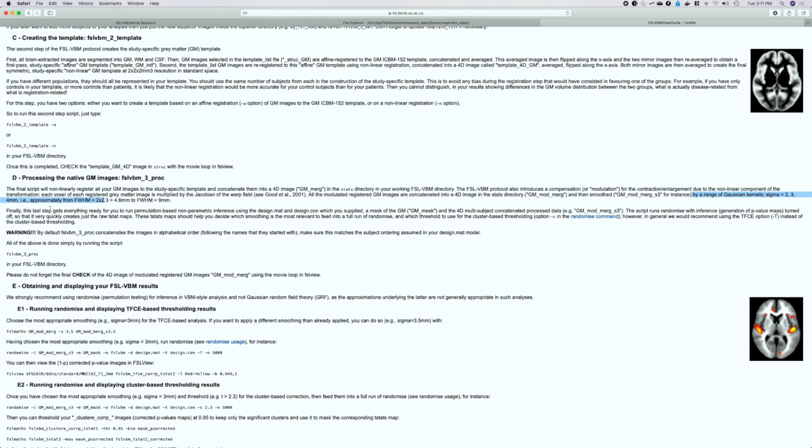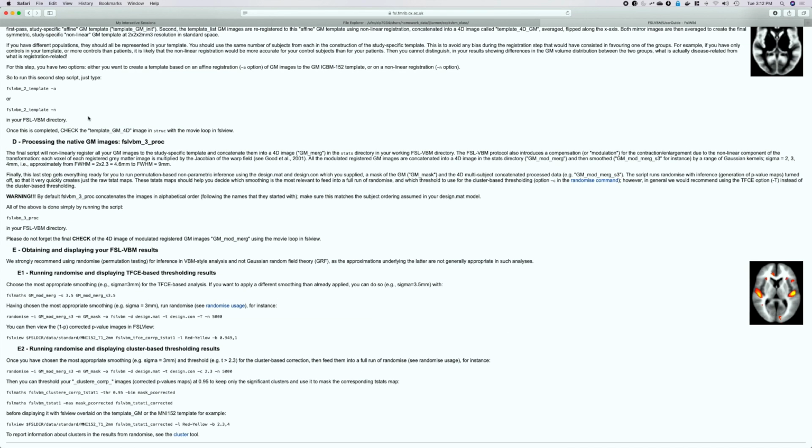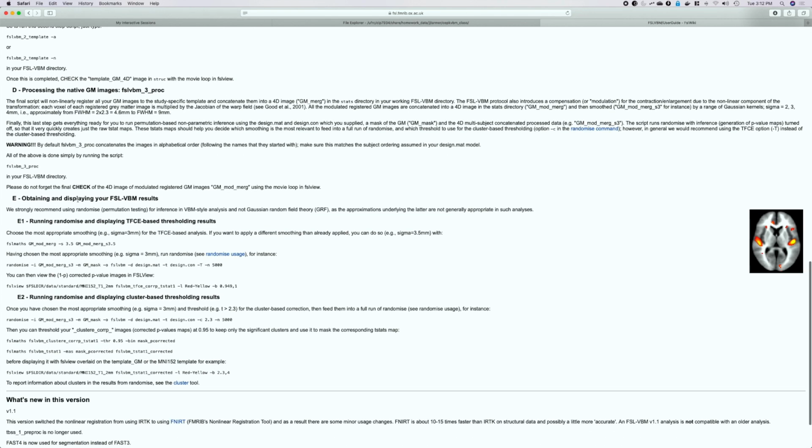And that'll just get rid of some of the noise, some of the variability that's caused either by noise in the scan or imperfect registrations of the brains to one another, the brains to the template really is what they're being registered to.